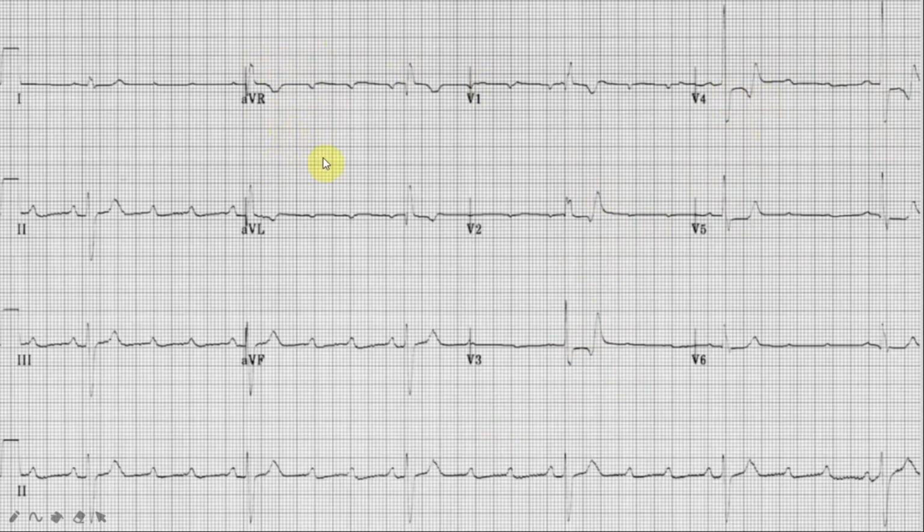Now, to compile all this information together, I am of the impression that the patient has a fixed ratio second-degree AV block. It is challenging to state if it is Mobitz type 1 or Mobitz type 2. As the QRS complexes are narrow, it is likely to be a Mobitz type 1 second-degree heart block. Further electrophysiological studies may be mandated to come to a meaningful conclusion. I am a little concerned about this patient. My immediate action would be to seek and treat the underlying cause. An urgent cardiology consult may be useful.